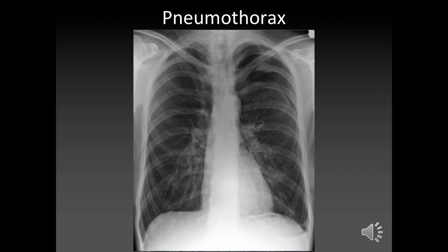So even like I did, I just jumped to COPD, but had I looked at it systematically, I would have noticed that there was a pneumothorax. That was all part of my plan, by the way.